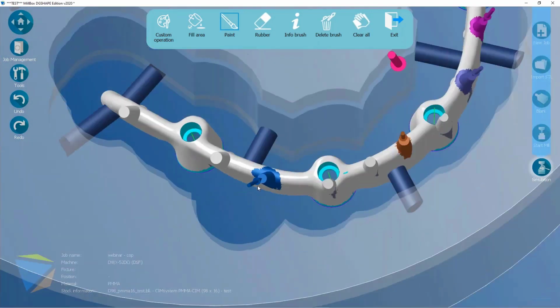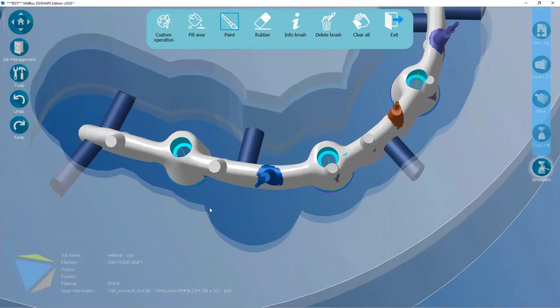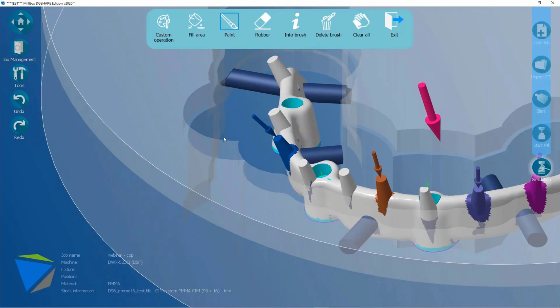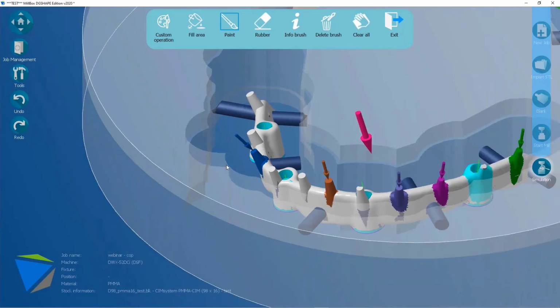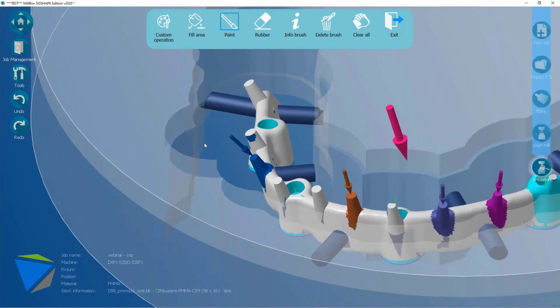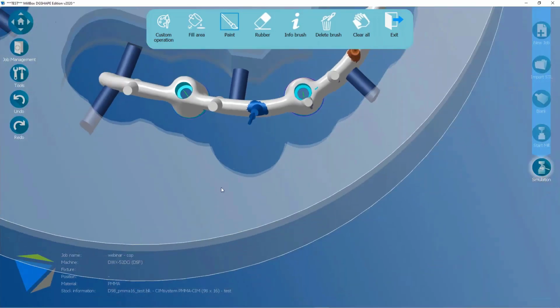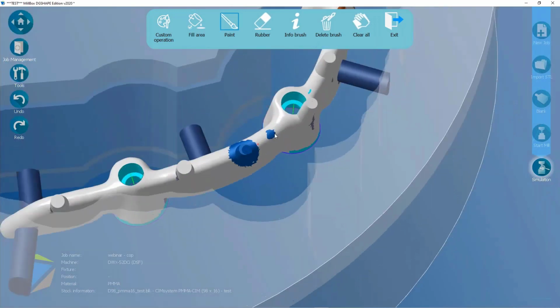Because of that, automatically, if you see, the offset area has been enlarged, because to enter by using this direction, the previous wall wasn't too narrow, so it was a limit, but it was critical. So automatically it identifies the necessary inclination to ascend with the tool, and automatically enlarges the offset area in order to have enough space to enter with the tool for this operation. Otherwise, it could be a problem.